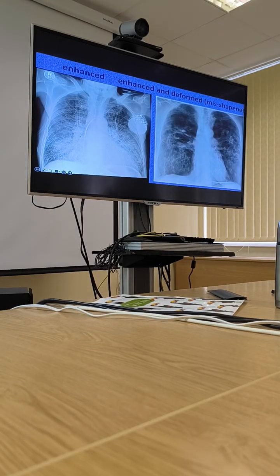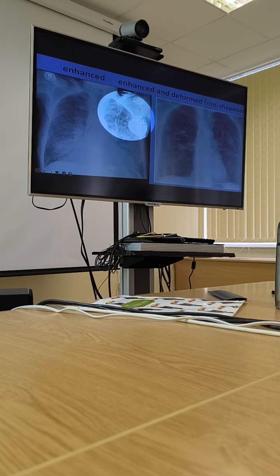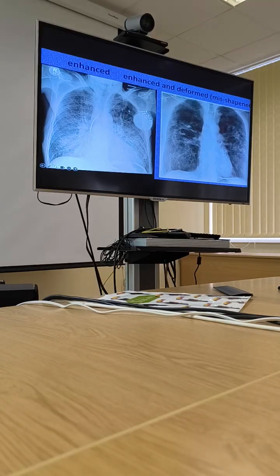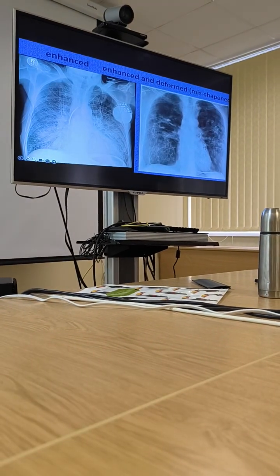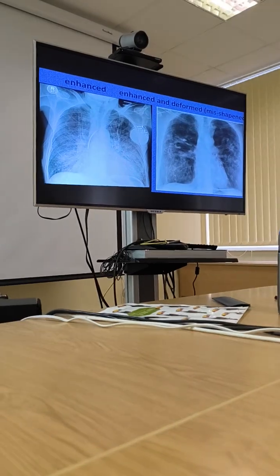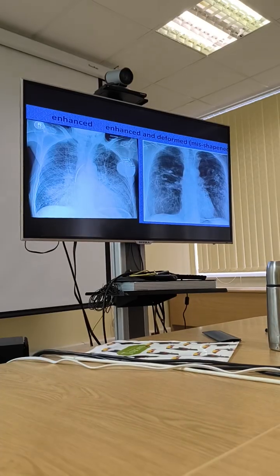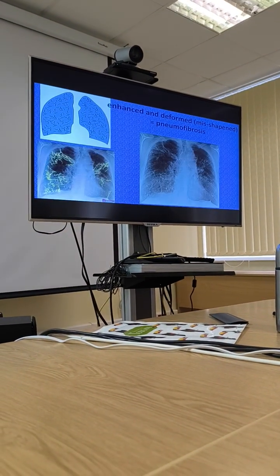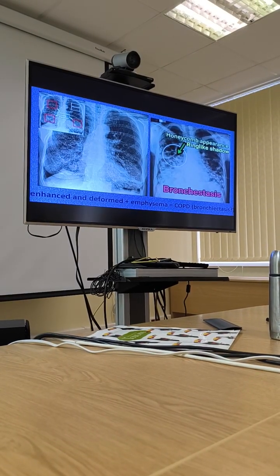The heart is really widened, and pay attention that the patient has a cardiostimulator, and so this is a cardiac failure picture, and this is pneumofibrosis, and it's basically more often accompanied with emphysema, like in chronic obstructive lung disease. So this is like this. Pay attention to this. And feel this difference.